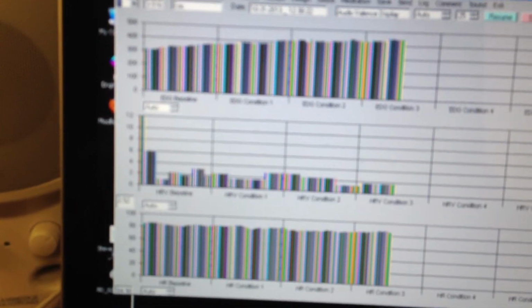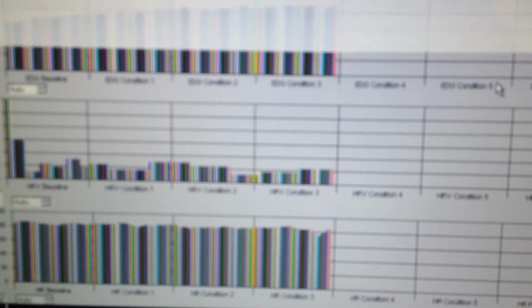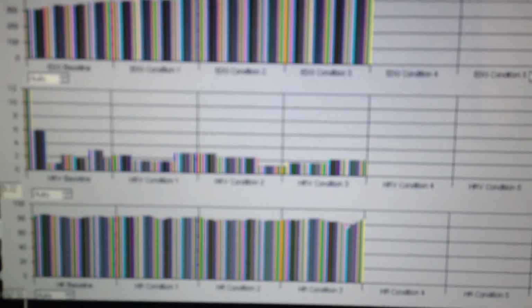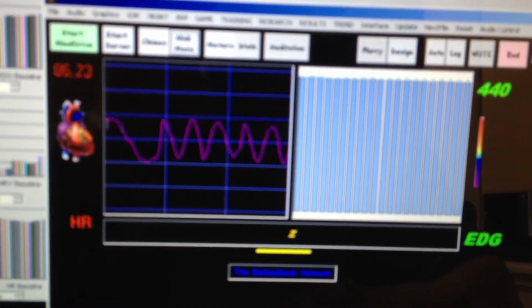We can take a look at our overall graph back over here and note the increasing trend in electrodermal activity and the variation in heart rate with the heart rate variability graph in the center in beats per minute. And those are coming in waves of 3 bars because of the averaging algorithm, and heart rate proper on the third graph. So that gives us our MIDI music capabilities.